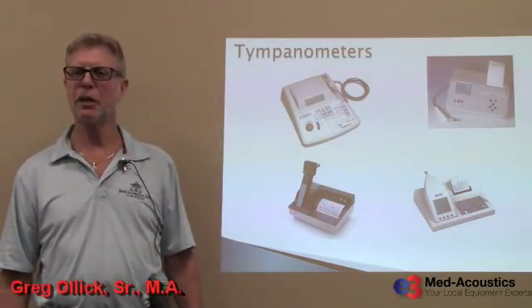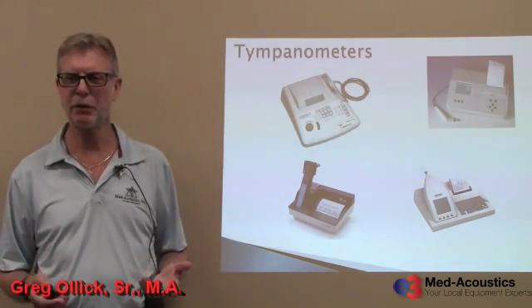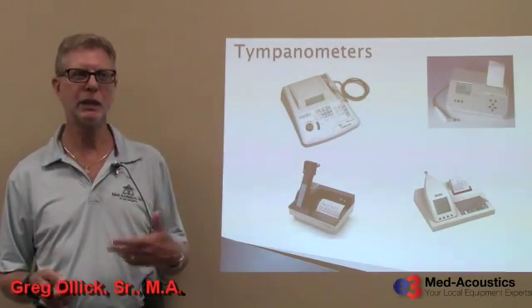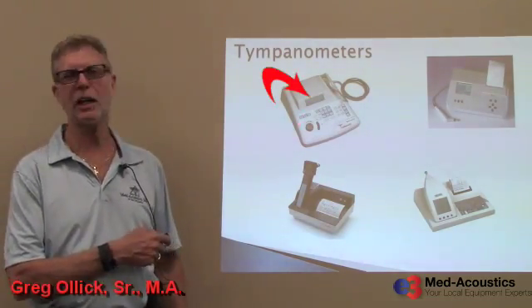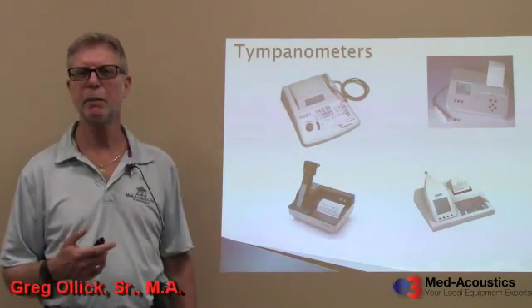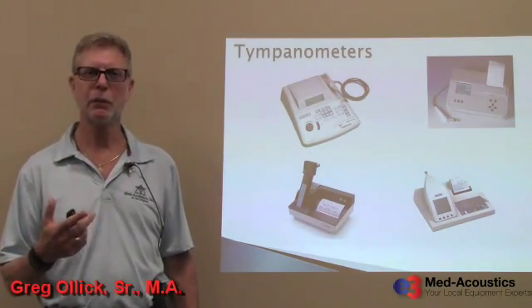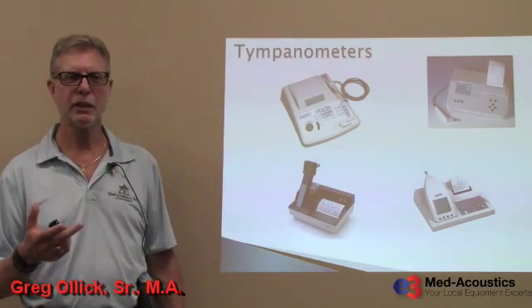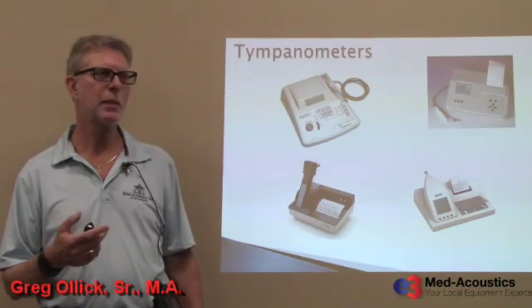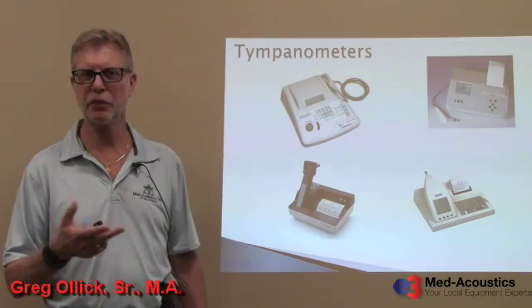These are examples of tympanometers. Some of them are relatively new, and some of them have been around for a while. Some of them have been updated to meet today's standards. This is the GSI 39 Grason-Stadler product, and that's available either as a conventional tympanometer with or without reflex threshold testing or reflex screening, and it's also available with an audiometer built in, just a pure tone audiometer.